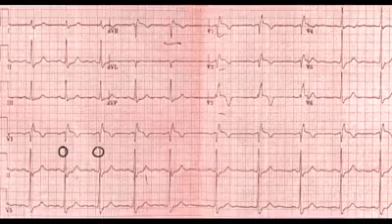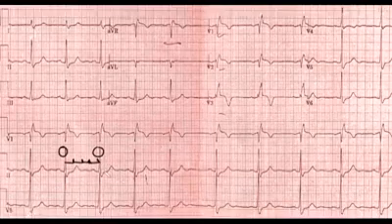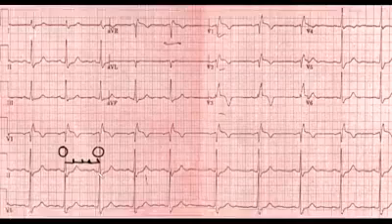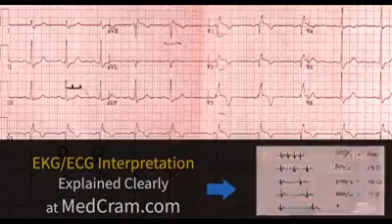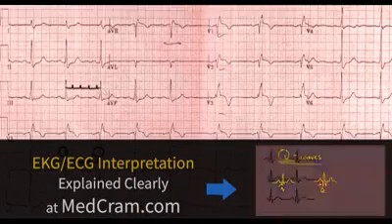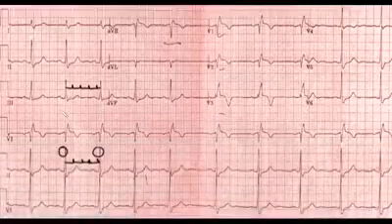We can see clearly that we've got 1 box, 2 boxes, 3 boxes, and then 4, and maybe a little bit extra. Again, let's look at another one up here: 1, 2, 3, 4, and a little bit more. Remember we go through the count.